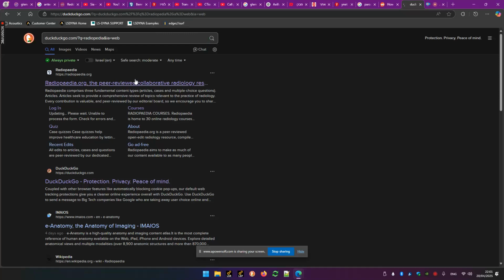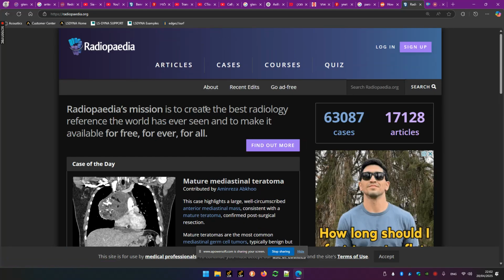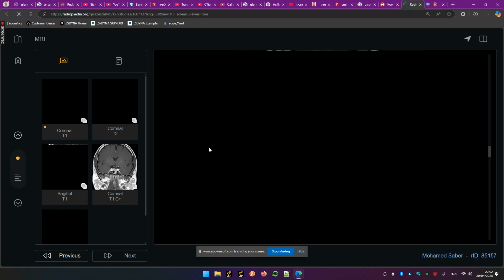Okay, so let's do a case in Radiopaedia. I don't know what the case will be of, but let's look at what we are going to get. So let's start a quiz and let's get something.